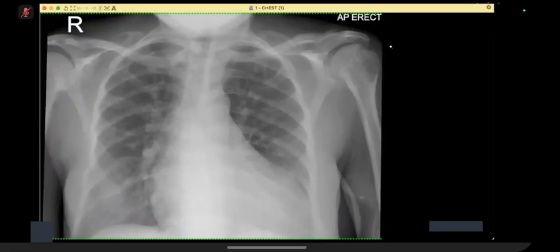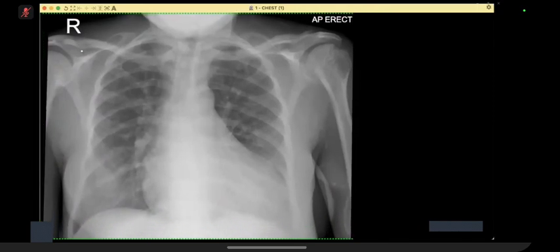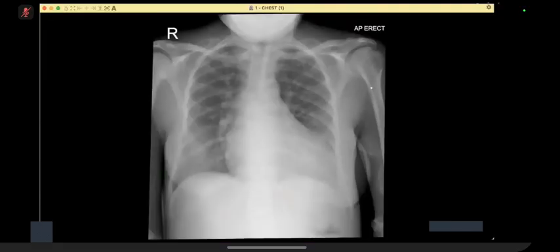I cannot see any soft tissue masses surrounding the shoulder joint, and the acromioclavicular joints look normal. On the other side, there are no abnormal findings on the right humerus. So this could represent an inflammatory process or aggressive lesion involving the left upper humerus.